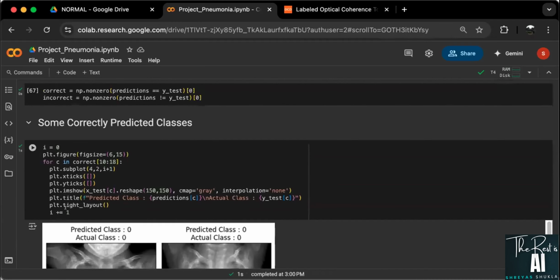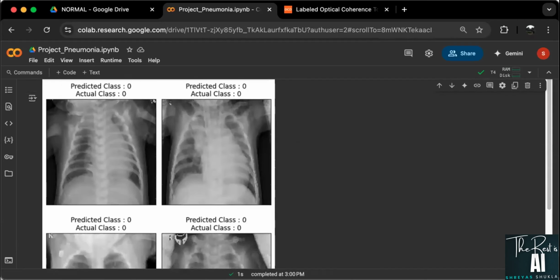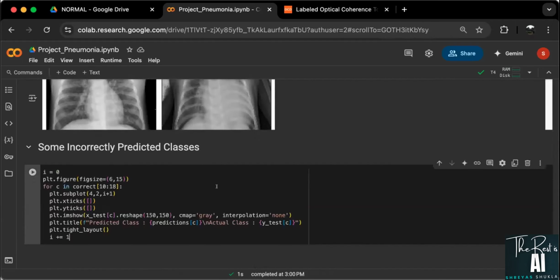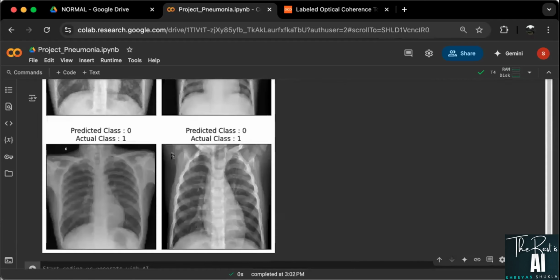and this one here as well. I'll take this. Just one difference would be there. I'll show you what that is. So everything is fine. I think we just have to get the classes. This is y_test and c, and yeah, this is what you have to do. You have to just put incorrect here. All right, and if you run that, there you go.